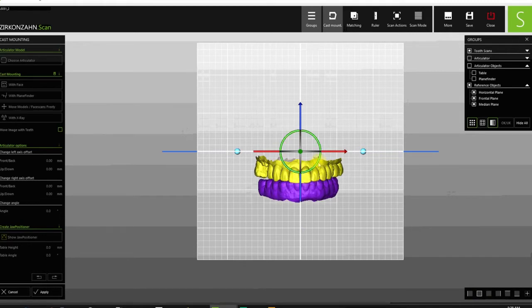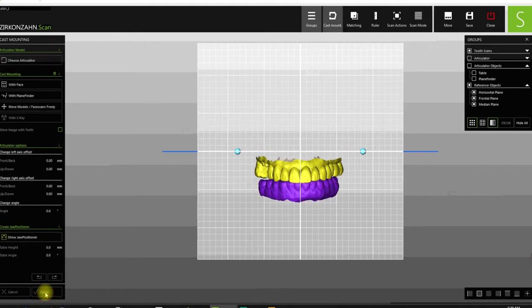Maybe my roll could have used a little help. Now I have all these lines to use. And also, what I don't have is the patient's face here, so who knows what I'm doing there. But that looks damn good. So I'm going to save that. Over here is the chore that I was doing, and I have to say apply, or none of that will be saved.